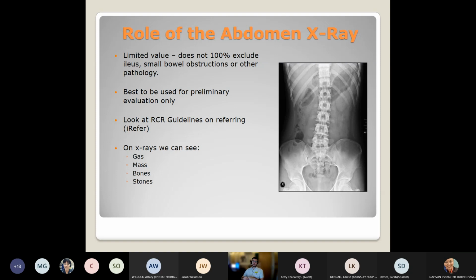And inflammatory bowel disease as well, colitis, X-ray can have some value, but again, it depends on the severity of the disease. And in the early stages, sometimes it isn't going to pick it up. So more often than not, if we see something suspicious, or if the X-ray is normal but there's still clinical concern, the patient will go on to have a CT of the abdomen.